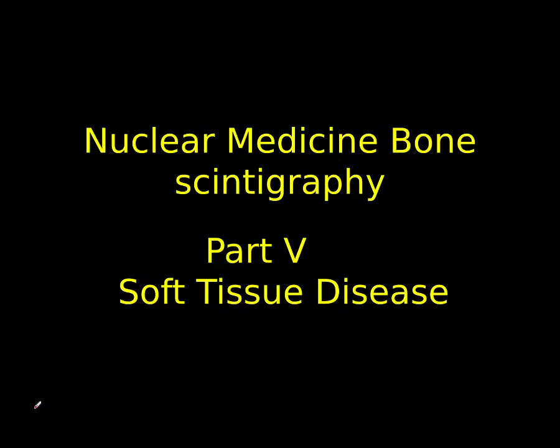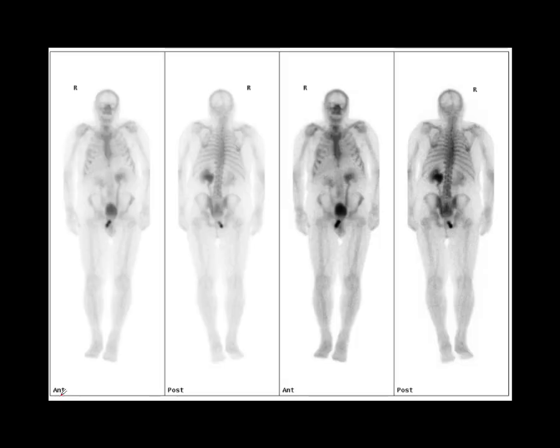Hello, welcome back to this series on nuclear medicine bone scintigraphy. So today we're just going to talk about soft tissue disease on bone scintigrams, and let's get straight to it.